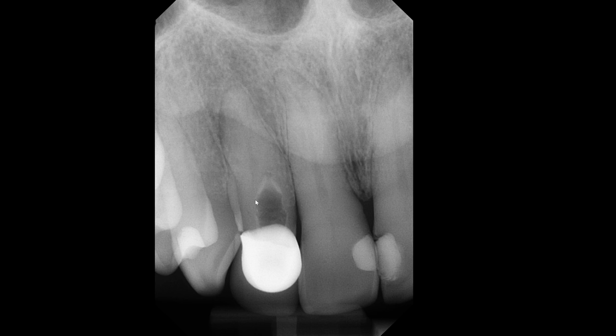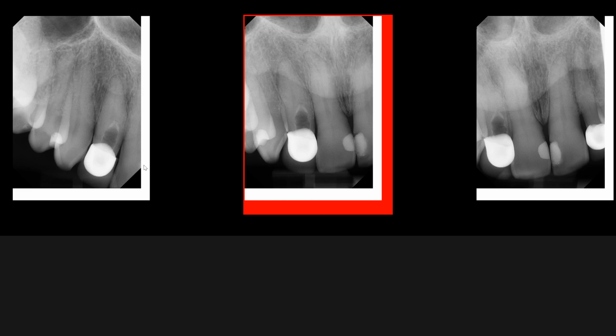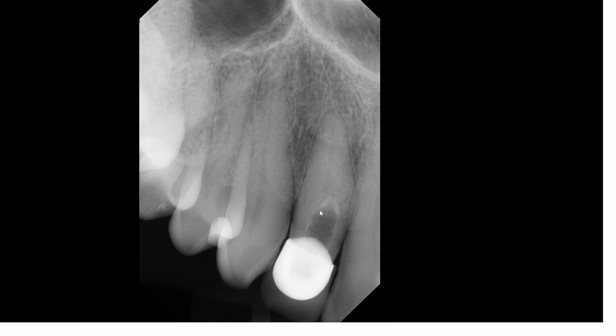Again, because of the presence of the radiopaque margin, and with internal resorption, you want this radiolucency to be continuous with the pulpal canal. It is hard to visualize the pulpal canal. It's really hard, but I don't see clear evidence that this radiolucency is an expansion of the canal and a continuation with the rest of the root canal, which is lacking. So because of that, I would certainly favor dens in dente much more so than internal resorption.